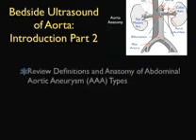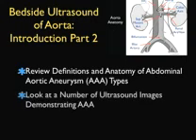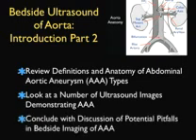In this Soundbites module, entitled Part 2 of Bedside Ultrasound of the Aorta, we'll look further at the spectrum of disease caused by aortic aneurysms. Hopefully you've joined me first for Part 1 of Bedside Ultrasound of the Aorta and know how to perform the exam of the structure as well as how to interpret images of the normal aorta.